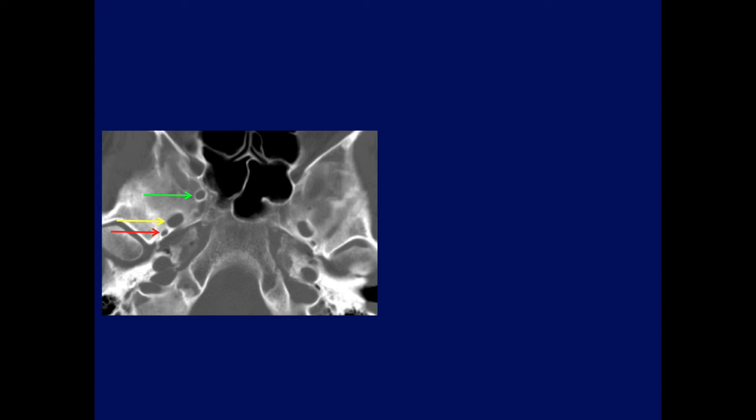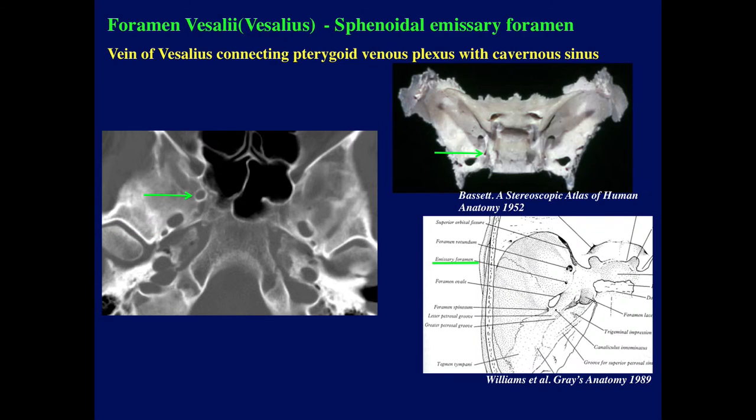A foramen that has not been mentioned so far. Rarely seen. Correct. Congratulations to Gaurav, foramen Vesalius. This is a foramen Vesalius, also known as the sphenoidal emissary foramen.